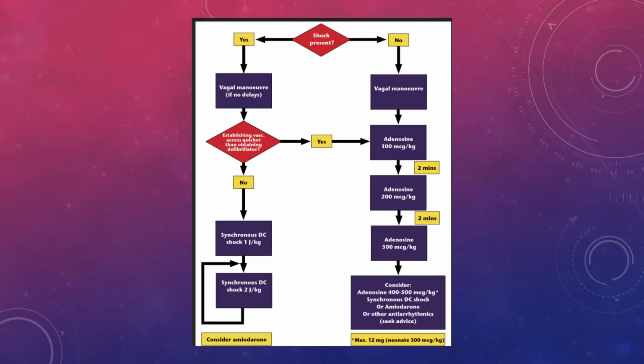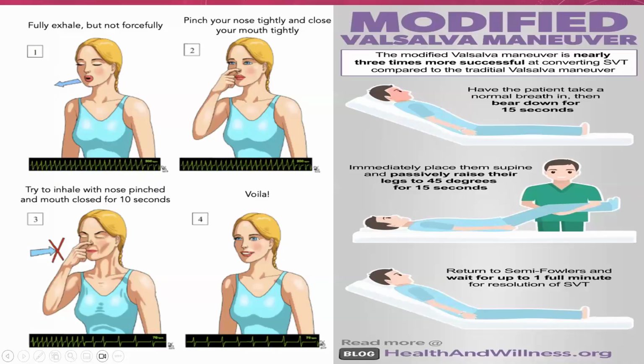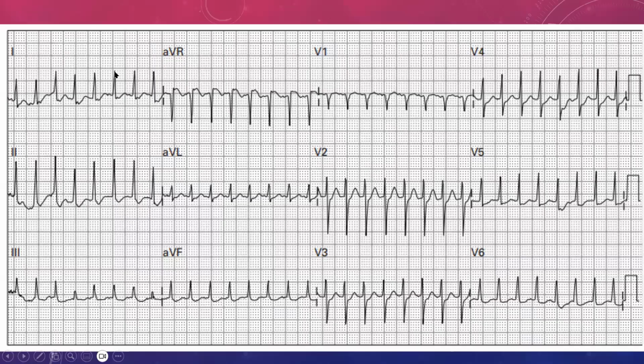In synchronized cardioversion, we are waiting for the peak of the R wave. Let's go back a little bit to our ECG. We are trying to hit the heart at this point, when it's at its absolutely most contracted. The reason for that has to do with the movement of sodium, potassium, calcium, all of these ion channels that have been opened and closed at that particular time.